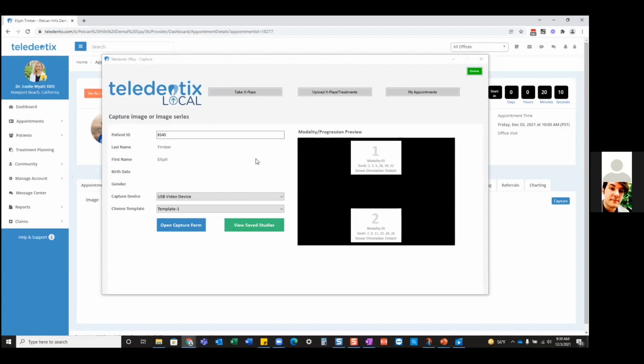But long story short, when you download the newly updated Capture app, when you first start your computer, you're going to get a message, like the ones you get when you update an app within your computer that ask, are you sure you want to make this change? It blanks everything else out and has you either accept or cancel. You're going to get that every single time you start up your computer.